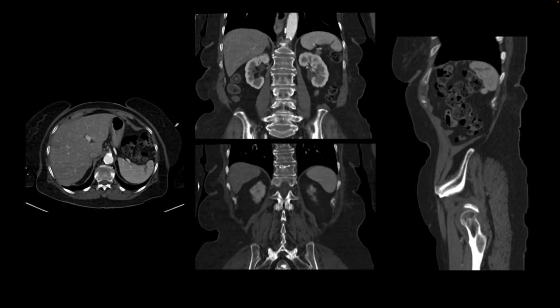This is our next patient. They presented with history of trauma, and a CT of the abdomen and pelvis was performed. On the axial image, we find this linear low-density focus in the spleen, suggestive of laceration. It's also seen here, and it is seen here. And so you want to use the AAST scale to give it a category or a class based on the system.